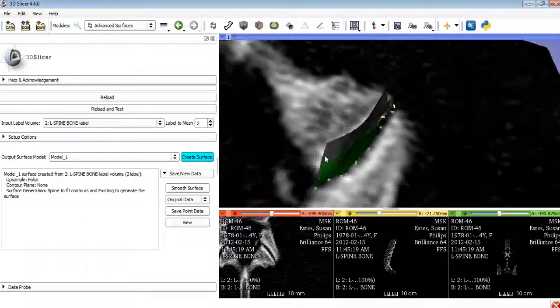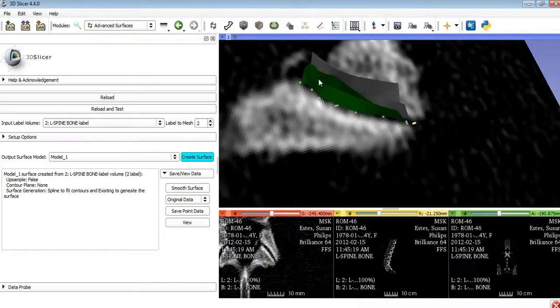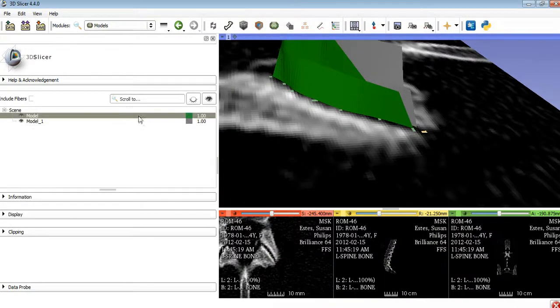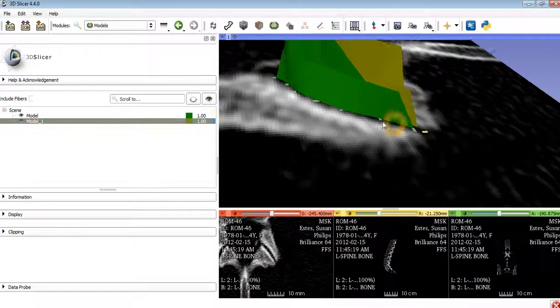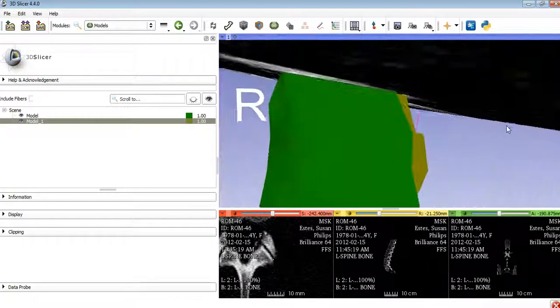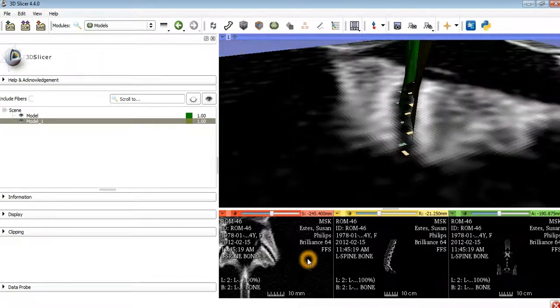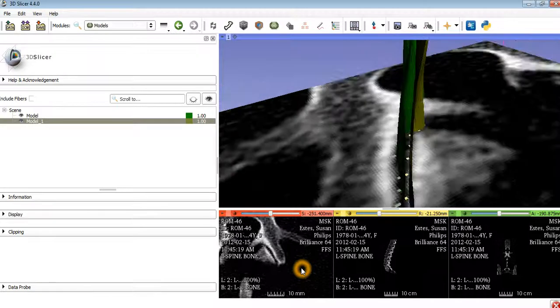Pretty basic again. Now there's, as you can see, there's some flat lines, and that's because some of the top and bottom slices were fairly sparsely populated. So you have these two surfaces here, and for the most part it looks like they have been approximated fairly well. And we'll keep going.